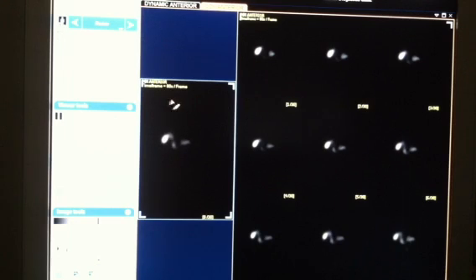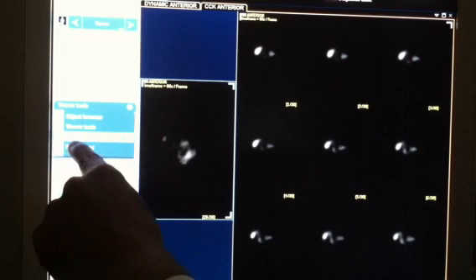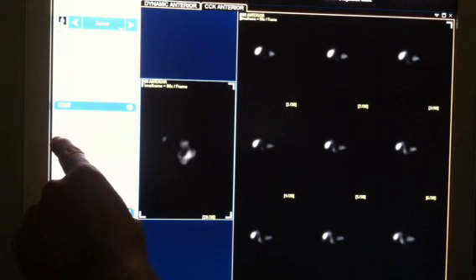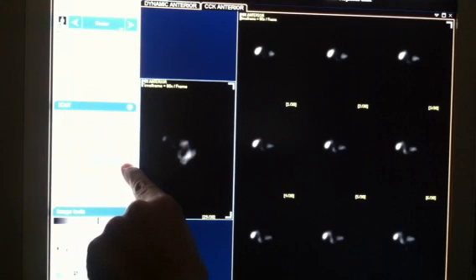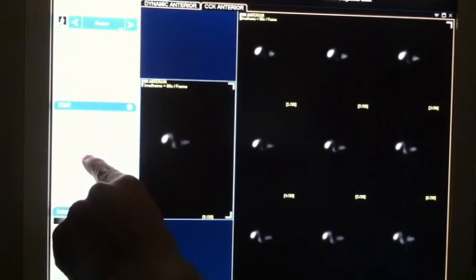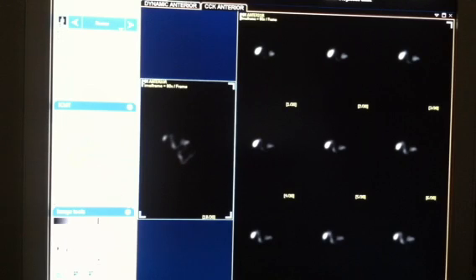So we're going to come here to Viewer Tools, tab down to the ICMT, and then we're going to come to the one that says Frame. And now we're going to start here. It's kind of got these backwards. What we're going to do is we're going to pick the Dynamic Anterior to be our first set, and it's going to automatically put the CCK Anterior to the second set. And we want to combine this into a single phase, so we're going to click on that.